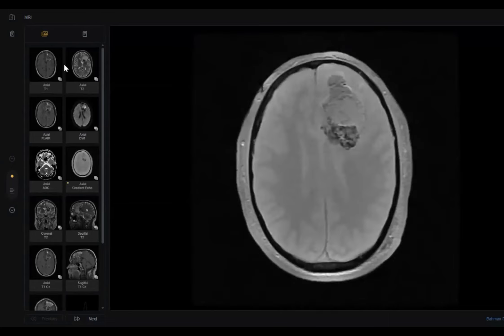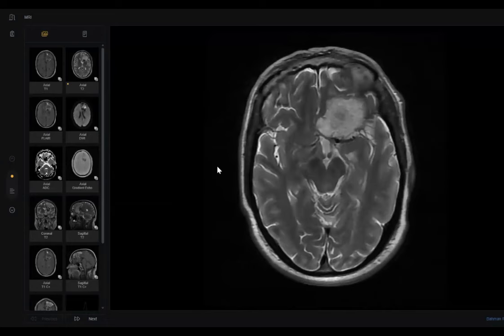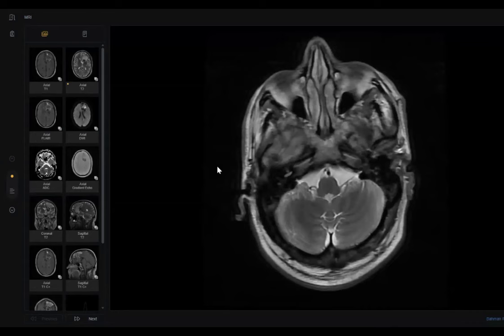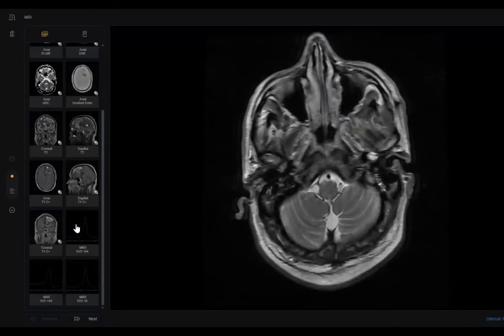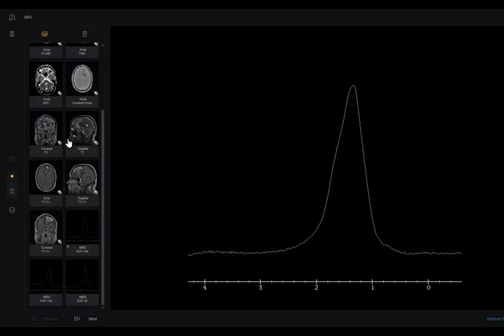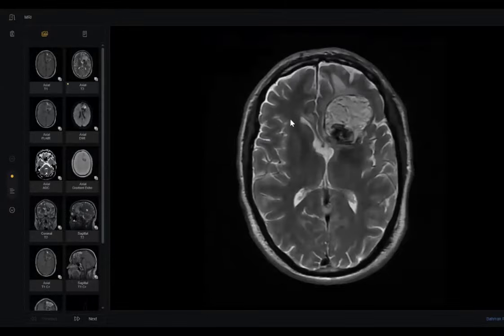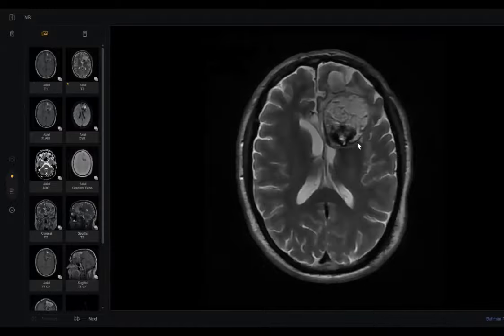What is the confusing word here? Most of us need fat sat to prove it. The examiner used something atypical, non-familiar for us. He brings this one. And what else is against hemorrhage here? If you look here, the hemorrhage didn't have a fibrous wall. Look, this fibrous wall.